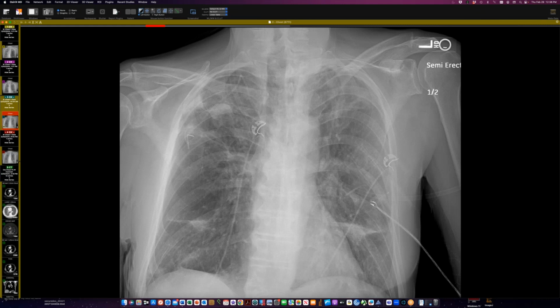So this person has messy looking lungs here. This person has metastatic gastric cancer and has had a lot of these abnormalities going on in the lung for many months. And then the person got short of breath and came in. Let me show you a series of radiographs.